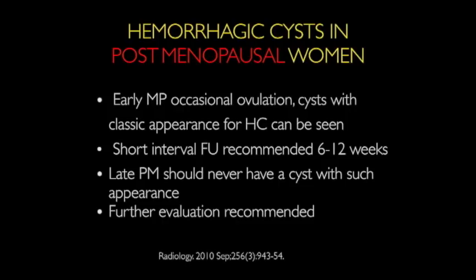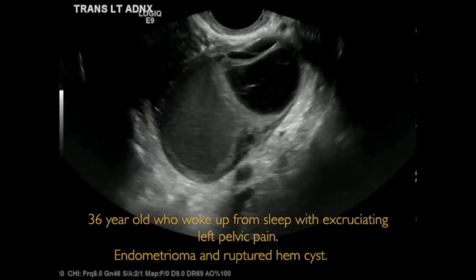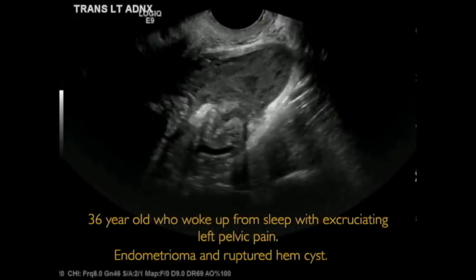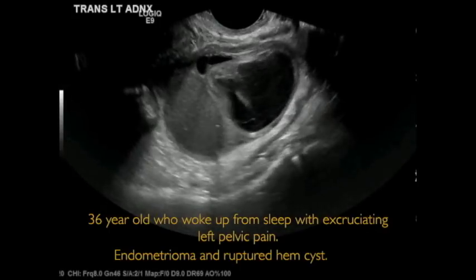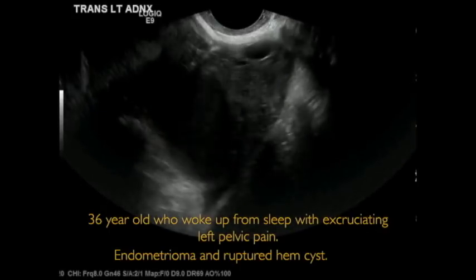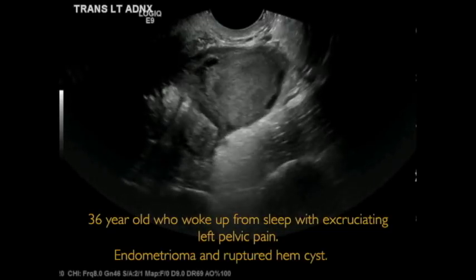So here is an example of a 36-year-old who woke up from sleep with, see the cine is not playing, excruciating left pelvic pain. In this case, you could see there is an endometrioma and a normal paired ovary otherwise, and also a hemorrhagic cyst. Not a lot of free fluid, but clearly her pain is due to the hemorrhagic cyst.